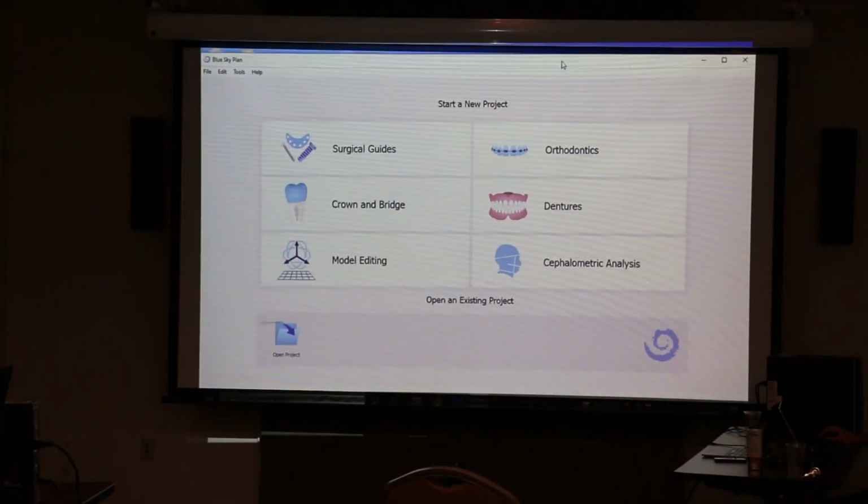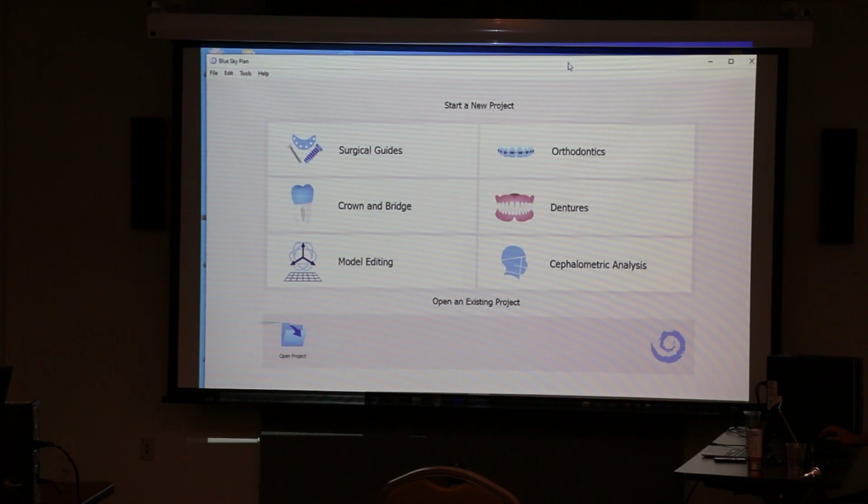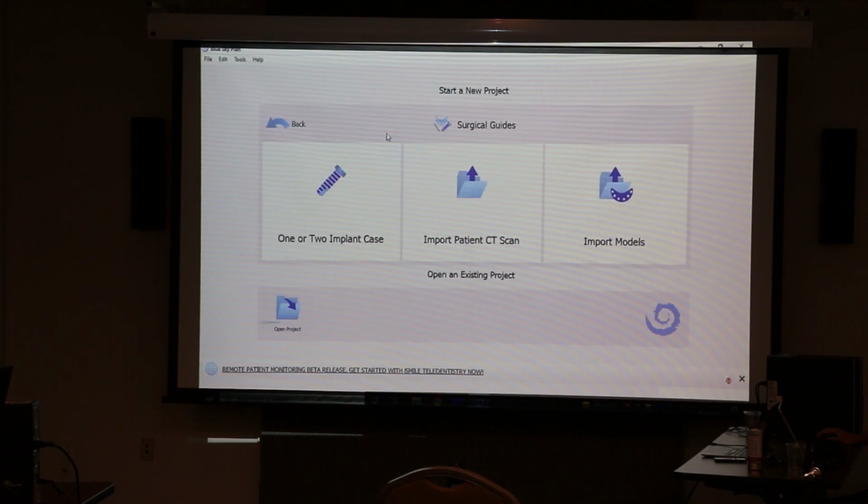We're going to do the bone segmentation and just kind of play with that. And then we're also going to talk about the alignment and how to see when it's incorrect and how to fix it.